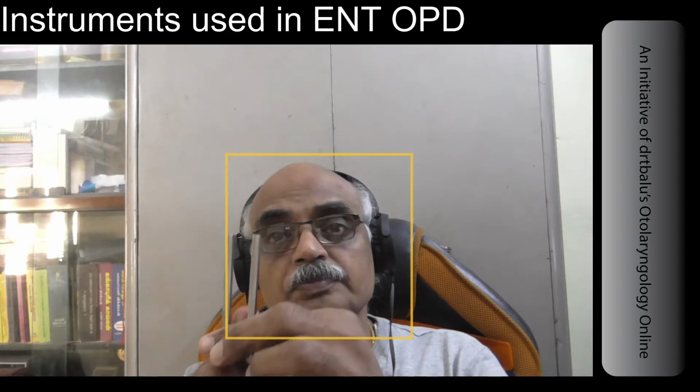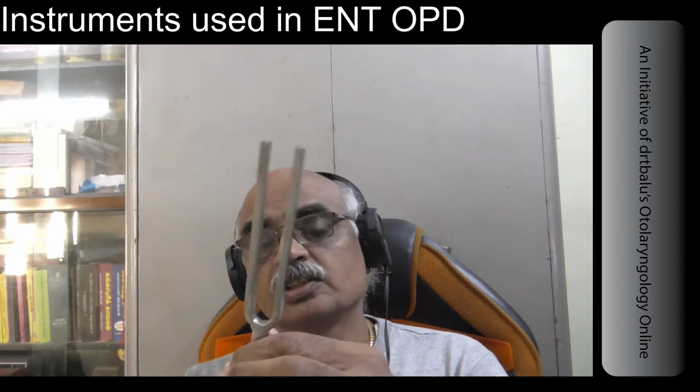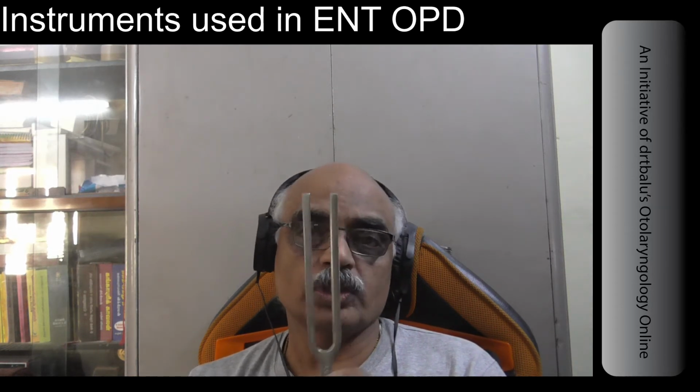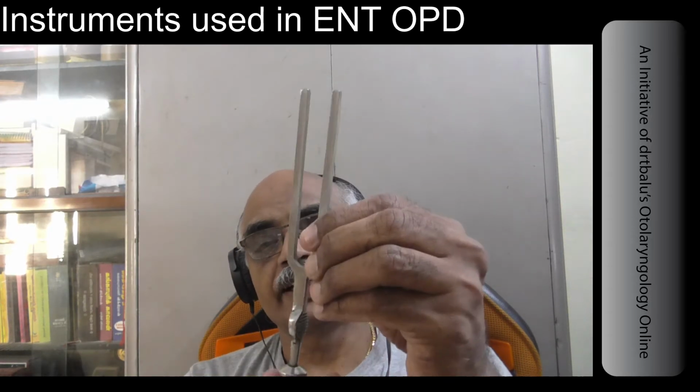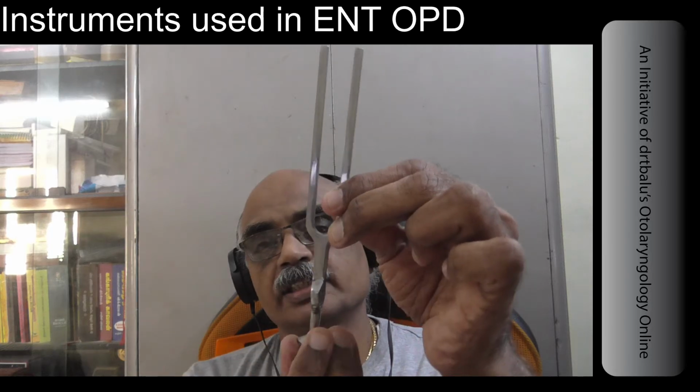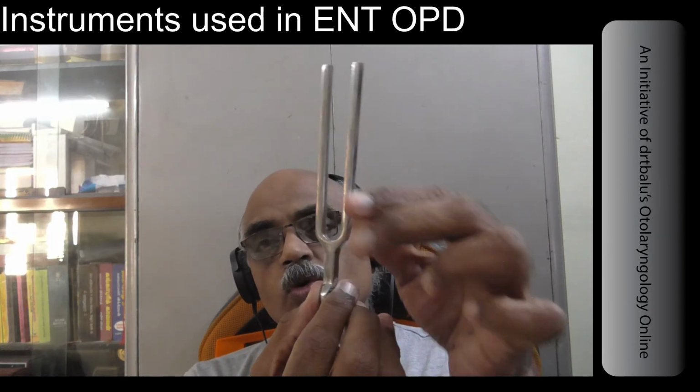The next instrument I'm going to show you is the tuning fork. You commonly use three frequencies: 256 hertz, 512 hertz, and 1024 hertz. This tuning fork has two limbs joined here, and then it has a base. This is where you hold. It has nice grooves to ensure that it doesn't slip out of your hand. You use your thumb to hold like this.